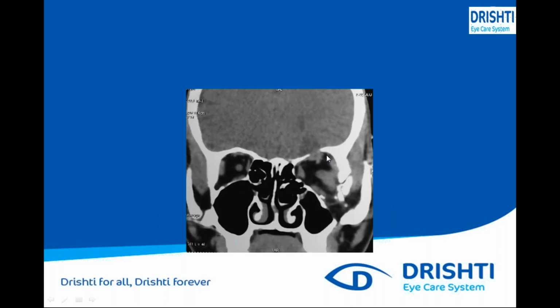Again, if you see here, this is the coronal cut. That was the axial cut. In this coronal cut, you can easily see there is an orbital fracture. So this is the orbital fracture. Again, there are other multiple fractures. How do you see this one? This is the regular bony area, and here you can see the exact fracture. So this is the orbital bone fracture.